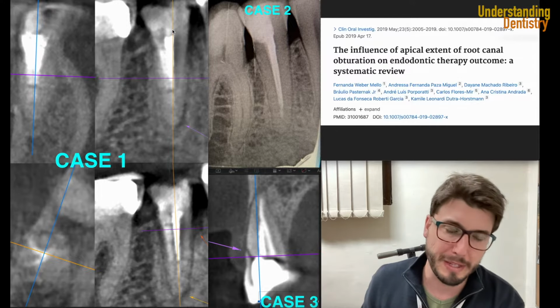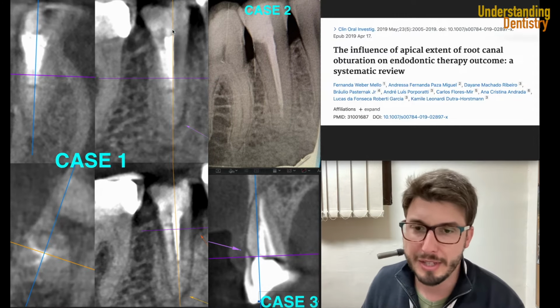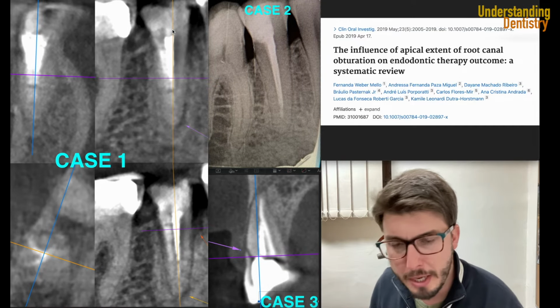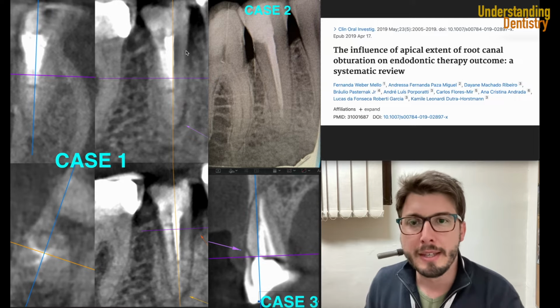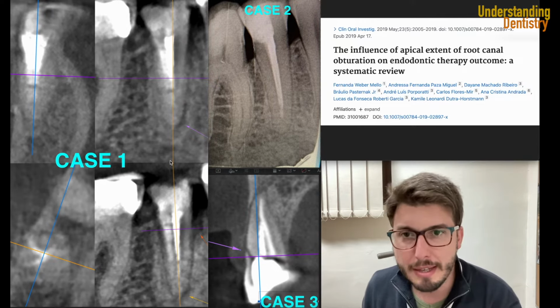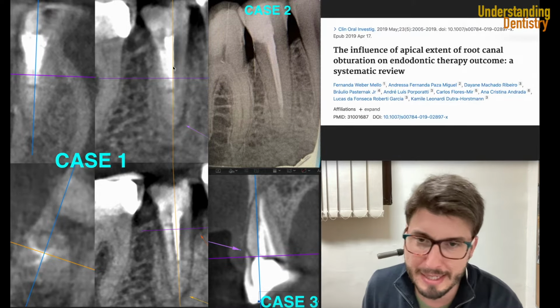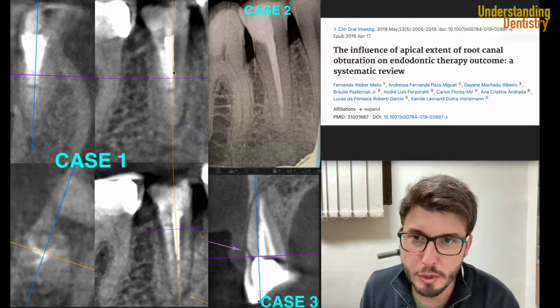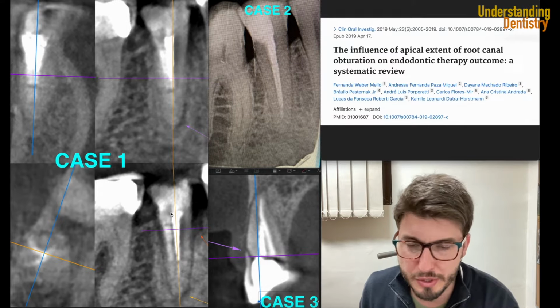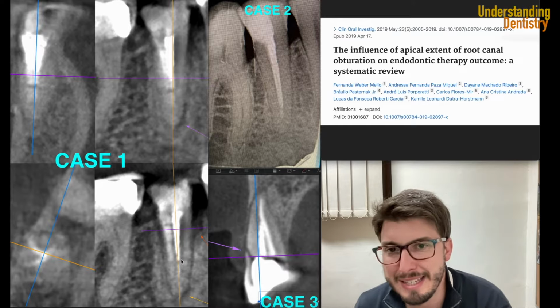We're not going to comment on the entire case, the medical conditions and everything, because that's too much. But we need to understand some situations here. Those are two different sagittal slices, basically an oblique plane, showing you mesial-distal dimensions.